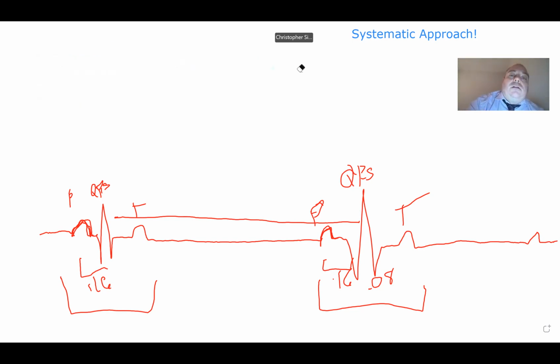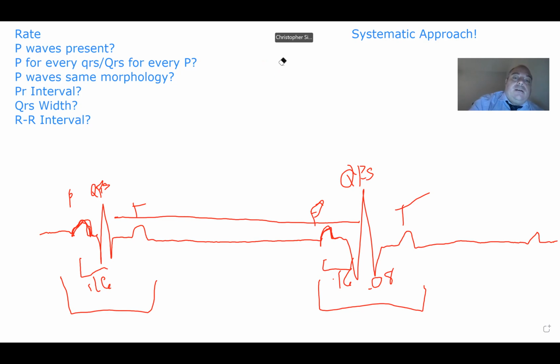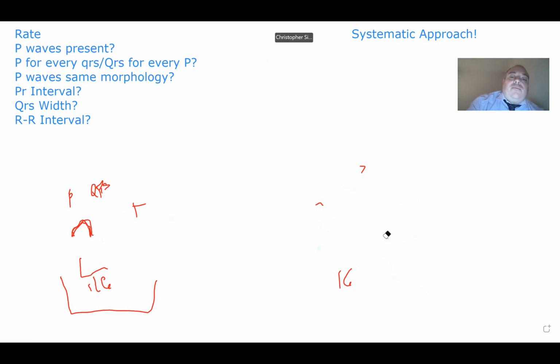So now let's look at one that's a little bit different.